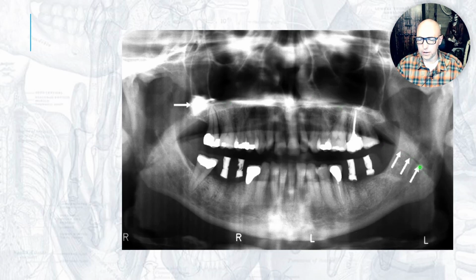What is this arrow pointing to here? We have a jaw fracture? Is this a lecture on fractures or is it on anatomy? There's your hint. This is just a little air gap. So what is creating the air gap? What is this huge thing? That's your tongue, remember, stretched out across the whole pano. You have the palate-glossal air gap here. And back, so here's our soft palate, right? Follow our hard palate back. Back here, that air gap is just very thin. So that's just the palate-glossal air gap on the soft palate, uvula, creating a small radiolucent line.